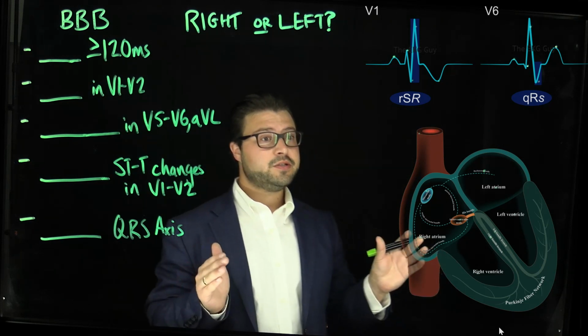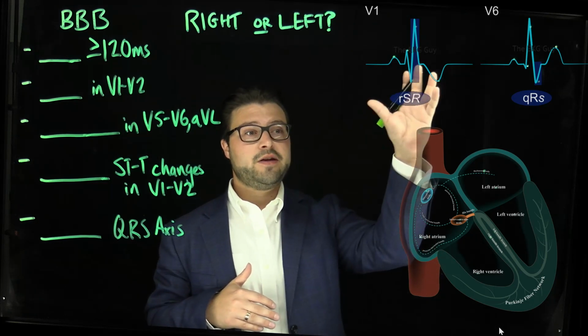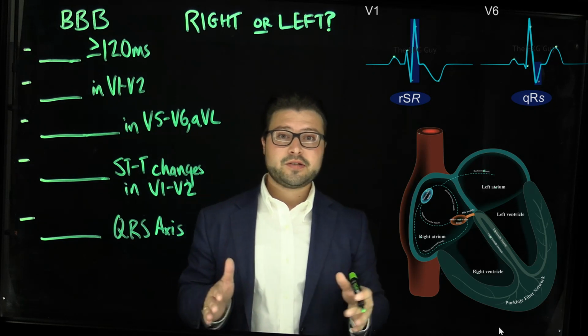What I want you to do here is, if you haven't, try to determine if this pattern here is right or left bundle branch block. You can pause the video and then restart it when you're ready.